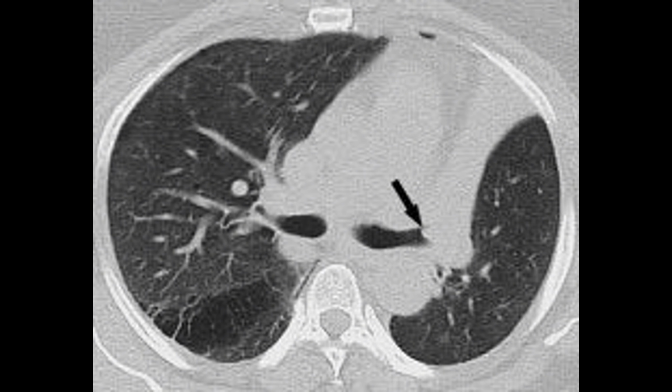The Luftsichel sign occurs because the left lower lobe hyperexpands posteriorly and curls around the medial margin of the aortic arch, creating a crescent of lucency adjacent to the aortic knob.